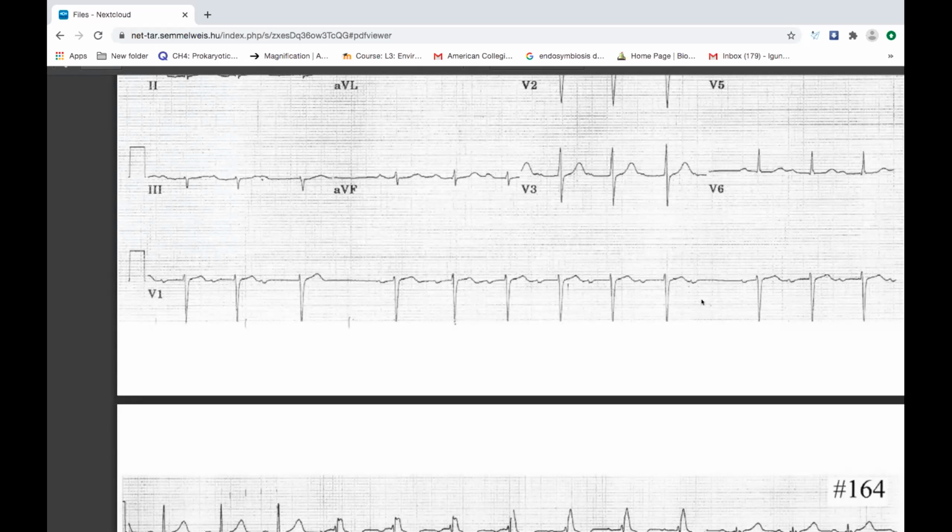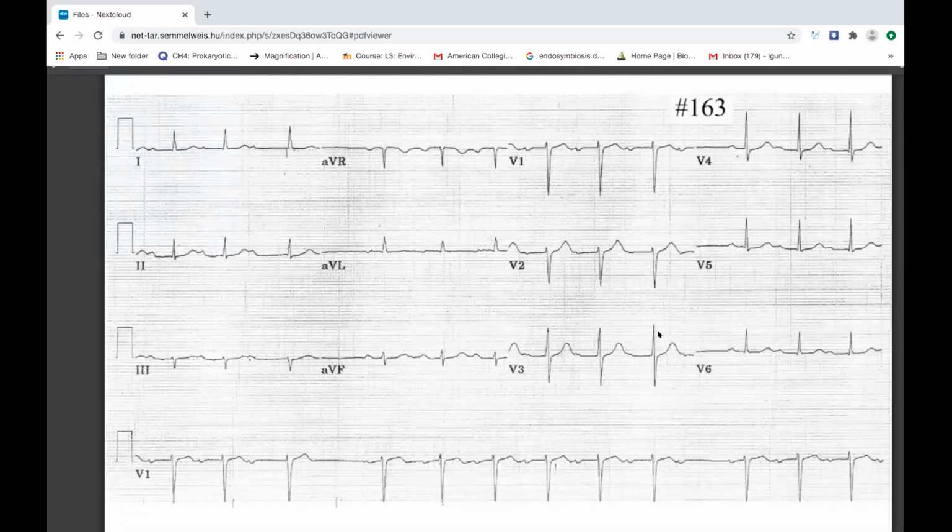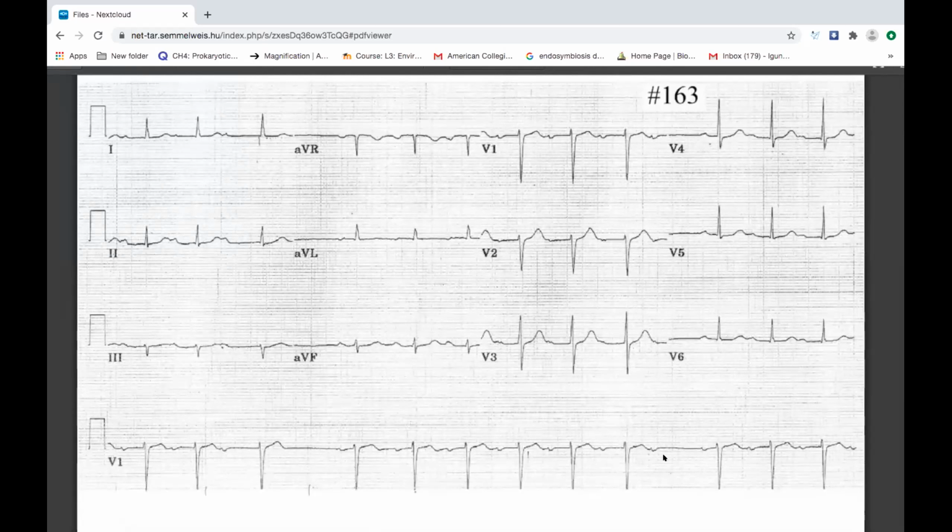Go on and let's see the P wave and the other P, the QRS complex, the axis. Now you can go and do it. And pathological Q wave, if you do have. Oh, well, we don't have one here. Like I already said, the axis is normal because lead 1 is positive. Okay, yes, it's very good.